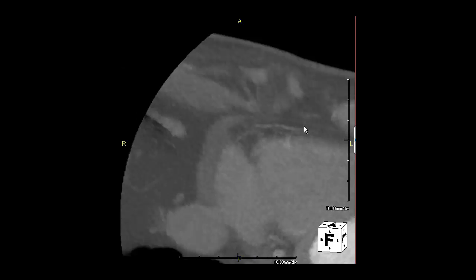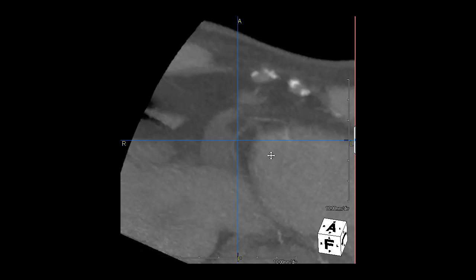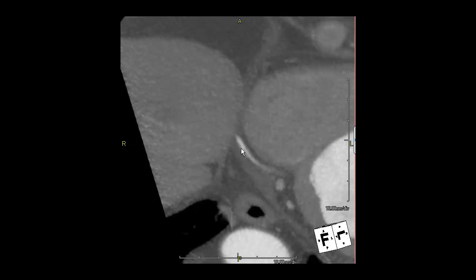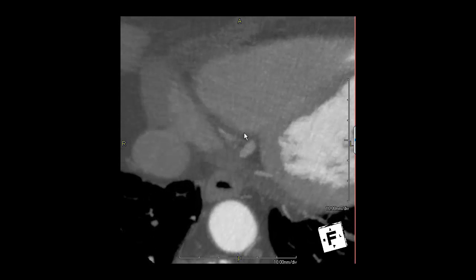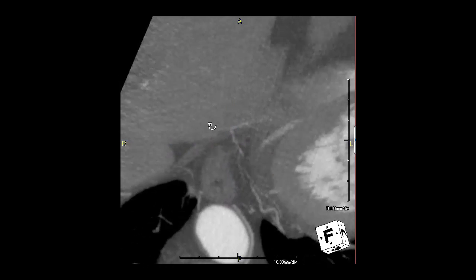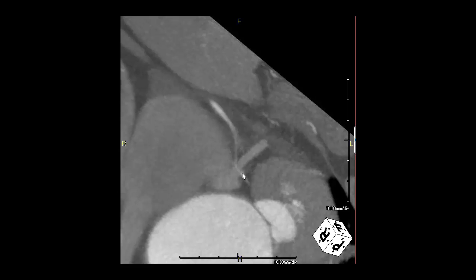Here is the occluded right coronary artery. We're right here at the crux. As you proceed distally, you can see that there's no opacification of the vessel until we get somewhere near the distal segment where there appears to be some element of opacification. Unclear if there's any flow into the posterior descending artery. There may be some flow into a small diagonal branch coming off, or a posterior lateral branch, but otherwise very, very poor flow in the distal reaches of this vessel.